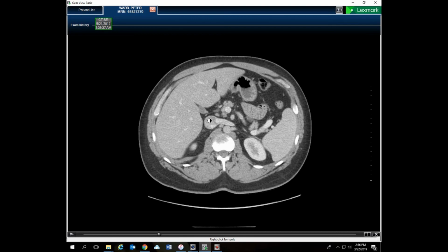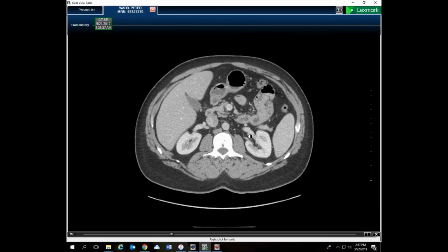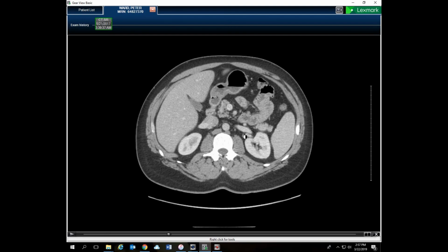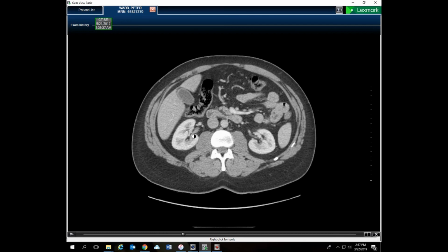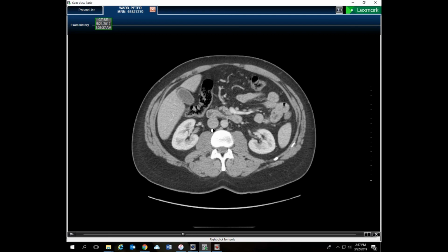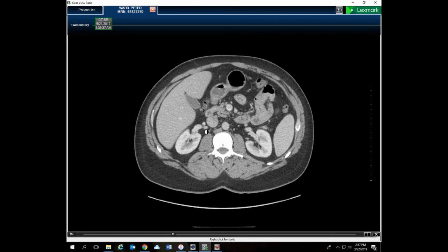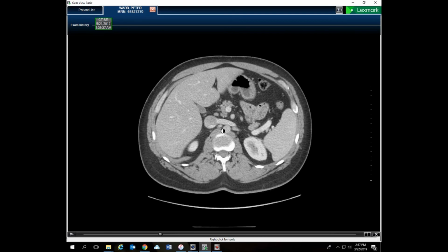But before we do that, let's check out the left renal vein draining to the inferior vena cava. So there it is, traveling across there. Nearby we've got the left renal artery paralleling it into the hilum of the kidney. Likewise, here on the right side we have the vein traveling in right there, and the artery passing posterior to the inferior vena cava on the right side.